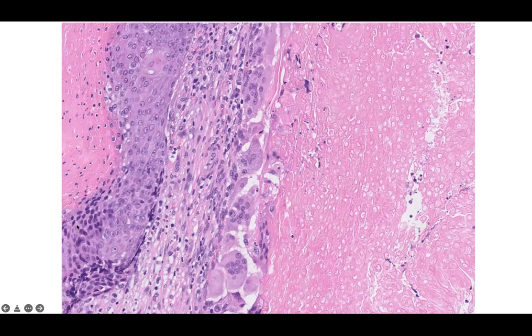So the cells on the left seem to be more hematoxylinophilic, and they seem to be more of a precursor cell. The cells in the middle appear to almost be giant cells in a way. However, it's unclear whether they're foreign body giant cells or some other type of giant cell. The cells on the right look to be shadow cells, meaning that they are just the outlines of previous cells that had been there before. The nuclei are completely gone.